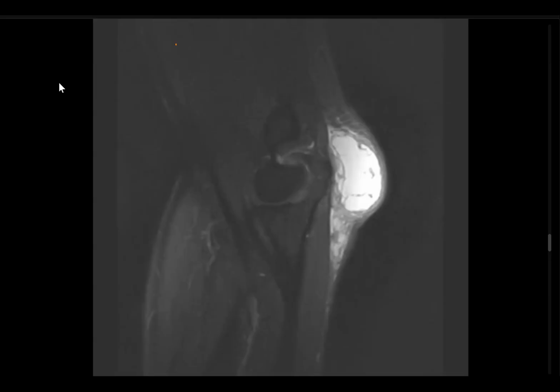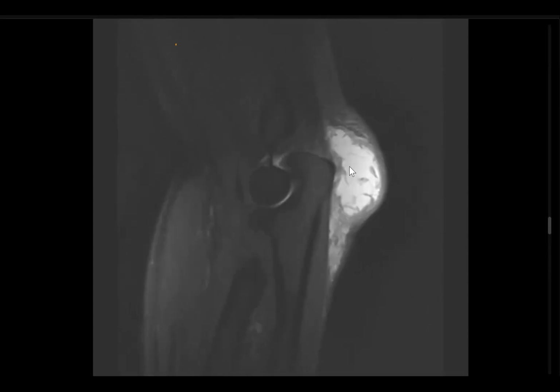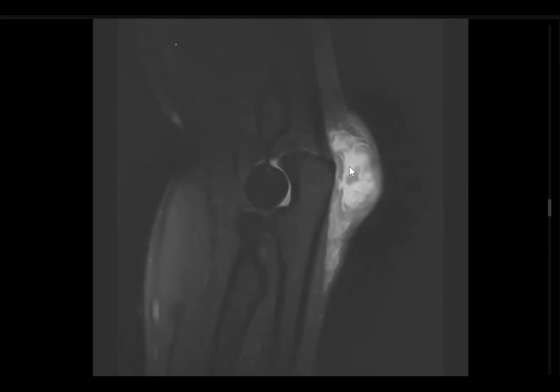You mentioned many differential diagnoses, but the correct one is not yet mentioned. It can be some anatomy. What is the location of this? It's adjacent to the olecranon. So one differential is tophaceous gout. It can be deposition of the crystals of gout in this position. Very good.